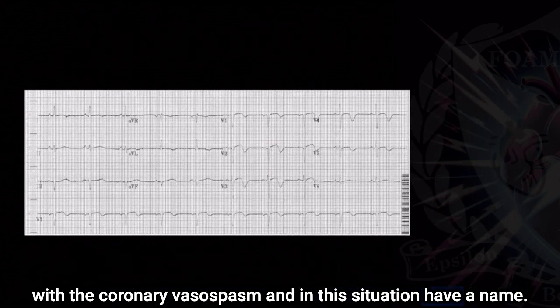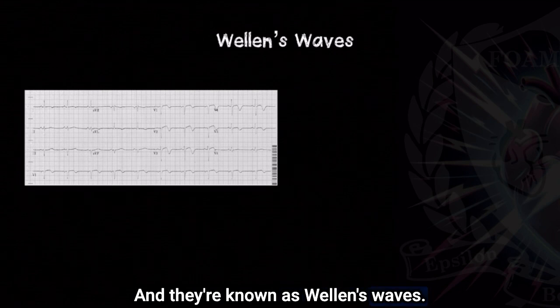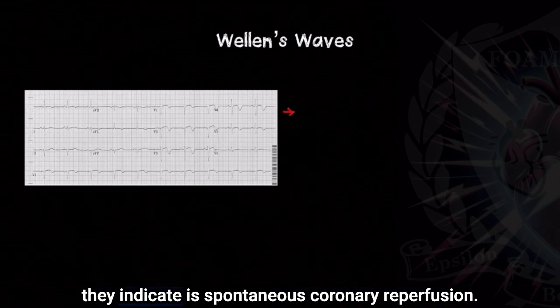These biphasic T waves that we saw in the previous example with the coronary vasospasm, and in this situation, have a name, and they're known as Wellen's waves. These are important to remember because what they indicate is spontaneous coronary reperfusion.